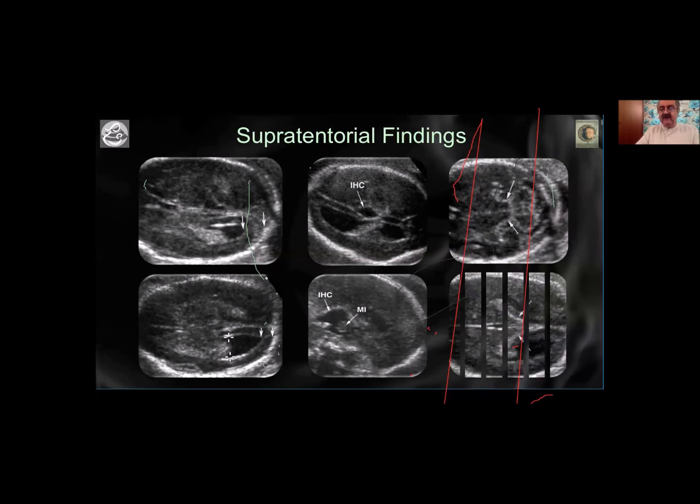And then this one, where the cerebral peduncles, instead of being blunt, actually have a sharp outline going upwards, a sharp pointed thing, and this margin, instead of being rounded, becomes concave inwards, and this is called a pointer or a beak. So this is the pointer, and this is the diamond, and this is the beak, and these are newer signs, not so new now, but you should become familiar with looking at images and saying, okay, I know this is normal, therefore this is abnormal.